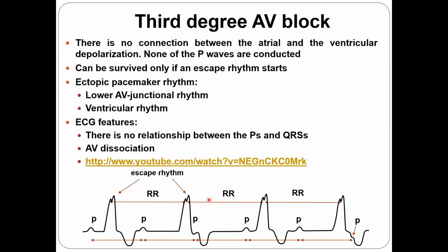Maybe you could confuse it with Mobitz type 1, but in Mobitz type 1, the RR intervals are not constant. And another thing, basically the QRS complex is normal in Mobitz type 1 AV block, because that's meaning the AV, when conducted, is reaching the bundles and giving a normal QRS shape. But here, these RR intervals are constant, and you do see very nice wide QRS complexes.